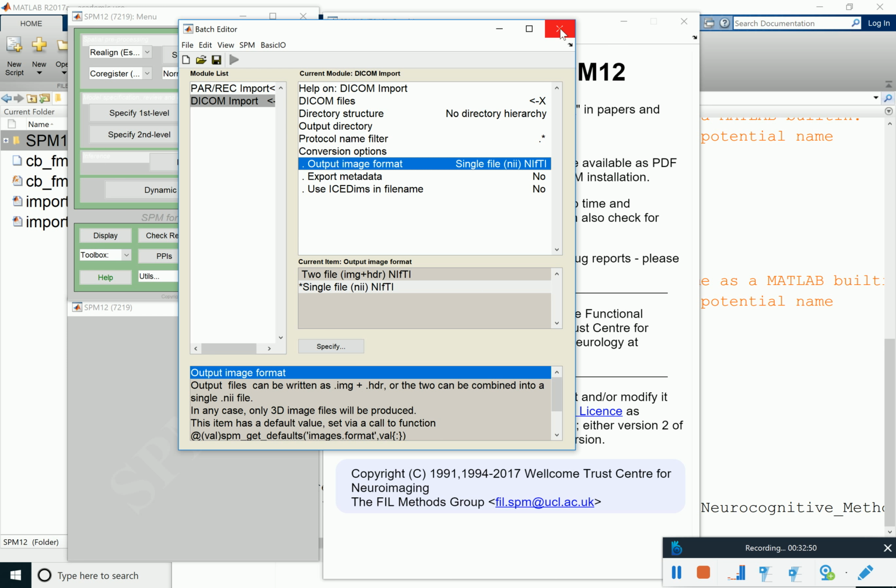The ideal world would be, and this is how it works in BrainVoyager forever, that you don't have these many files, a single file for each volume. What is annoying about this is not so much that you have that many files, but that if it does something, it needs to write all these files. To write on a hard disk and also to synchronize between different things, the problem is not so much to write and synchronize one big file. The problem is this accessing and again accessing hard disk space. So it's a little bit annoying.